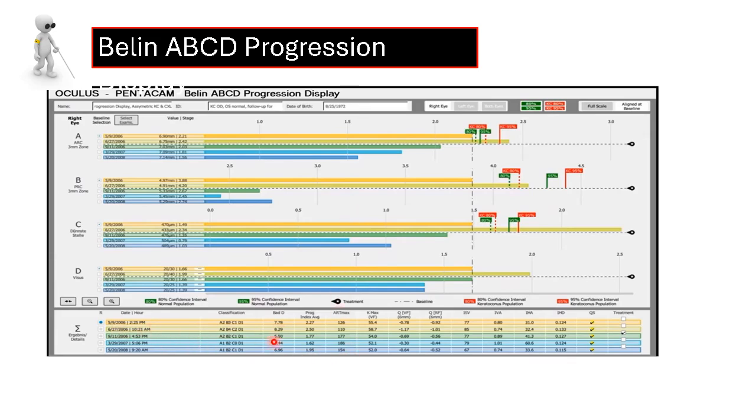Here is also another tabulation for the other risk indices or ectasia indices that are used for following the keratoconus, based mainly on the anterior surface of the cornea. This is from the previous classification, also placed here. But this is the mainstay and the main bulk of understanding.